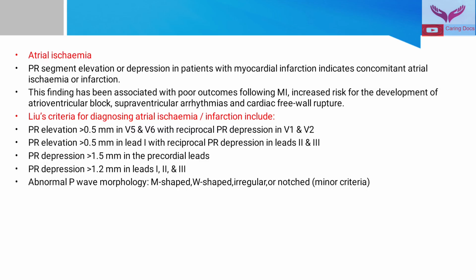In atrial ischemia, the PR segment elevation or depression in patients with myocardial infarction indicates concomitant atrial ischemia or infarction, and this finding has been associated with poor outcome following the MI, increased risk of development of atrioventricular block, supraventricular arrhythmias, and cardiac free wall rupture.